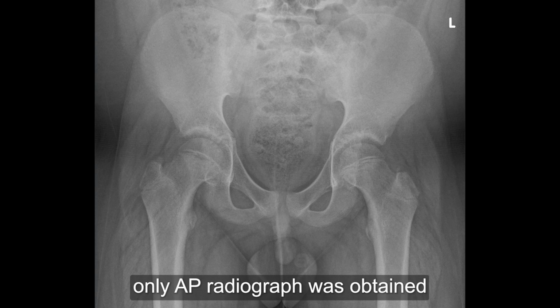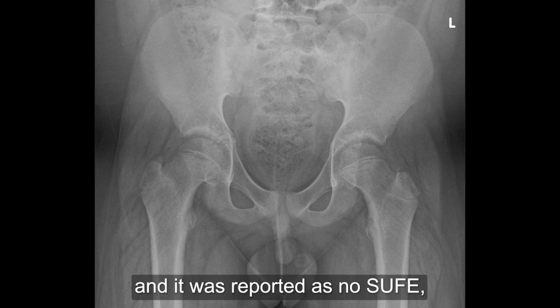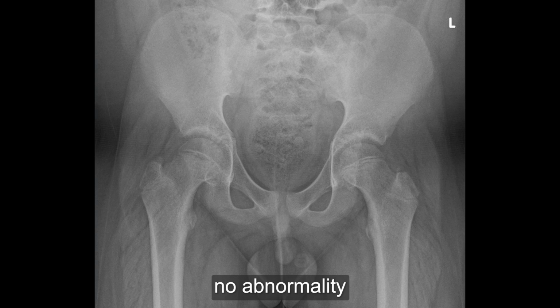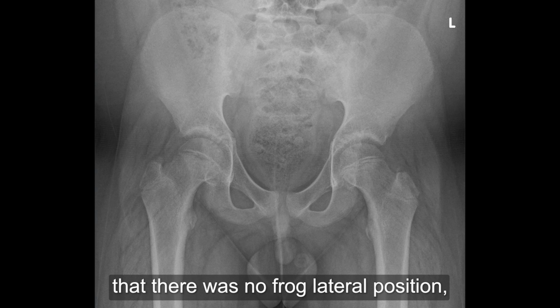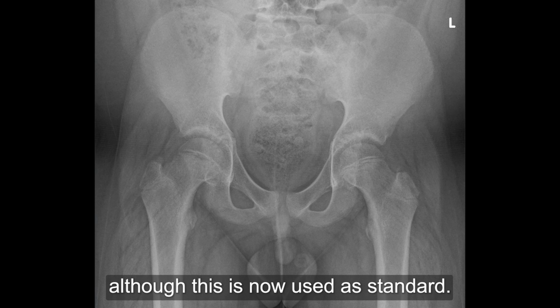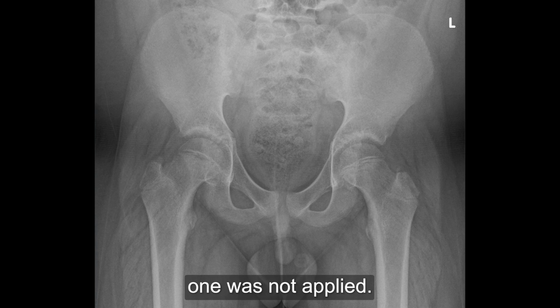In this instance, only an AP radiograph was obtained and it was reported as no SUFE, no abnormality, and the patient was sent home. There was no mention in the report that there was no frog lateral position, although this is now used as standard. So rule number one was not applied.